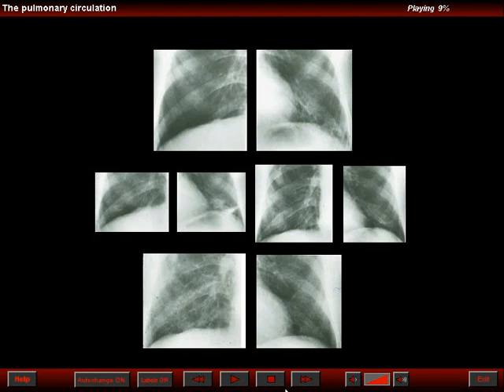This patient developed chest pain in the left base. The upper row shows no abnormalities. The middle row shows, in the left lung, an area of discoid atelectasis. The bottom two images show a reticular pattern of the right lung and the disappearance of the atelectasis of the left base.